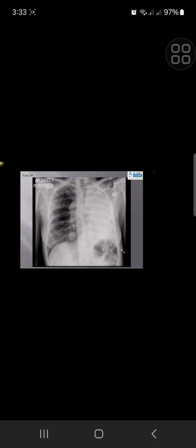So in a patient with total whiteout of the lung with ipsilateral shifting of the trachea, I am thinking of total lung collapse together with the opacity in the right lung. This could be due to a central bronchogenic tumor with metastasis to the contralateral lung as well.